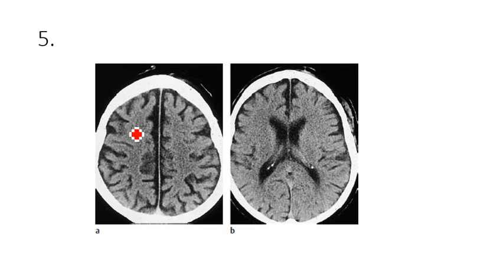Now, the sulci and gyri were effaced. What happens when you see them too much? You see that they're too prominent, the sulci and gyri. So we say prominent sulci and gyri, which is the inverse, which typically means cerebral atrophy. The brain tissue is starting to become atrophic, whether it's a chronic alcoholic or you see it as the patient starts aging, the elderly, the brain starts shrinking. You see there are now more pockets of CSF, the brain tissue is a bit atrophic, and there's this prominence of the sulci and gyri. It indicates that there's cerebral atrophy.